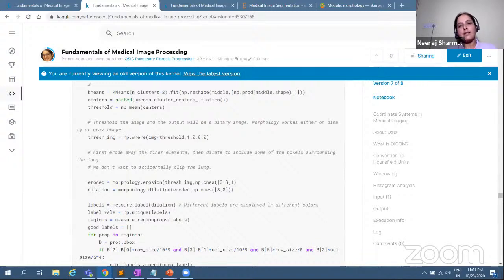Okay, so basically these are the segmented images. Now they are ready to be fed to deep learning, and for this particular problem set, we have to predict the FVC values for the next few weeks. Based on those FVC values, we can see whether the patient's condition is deteriorating or not.